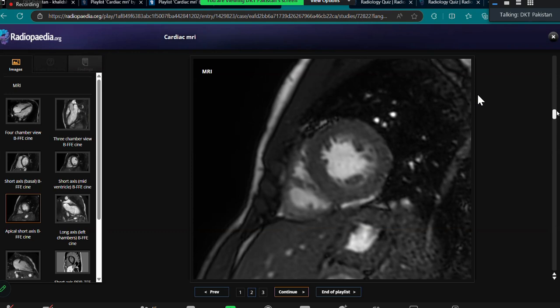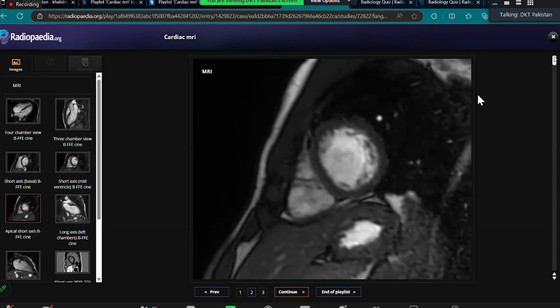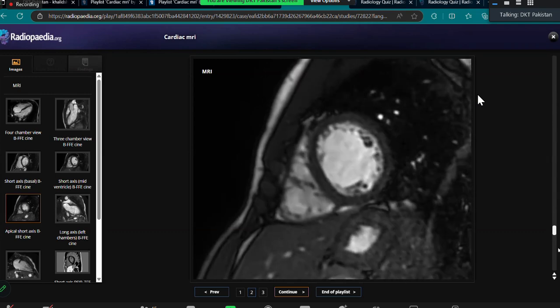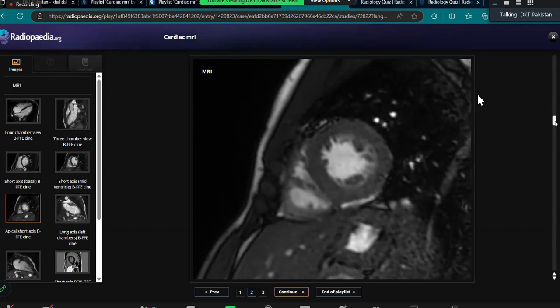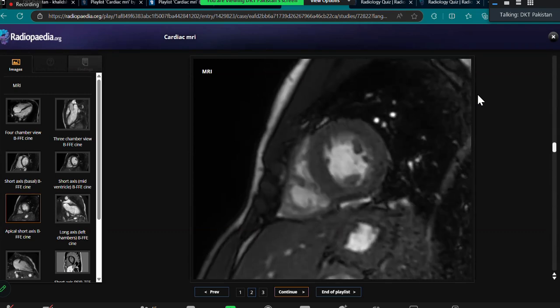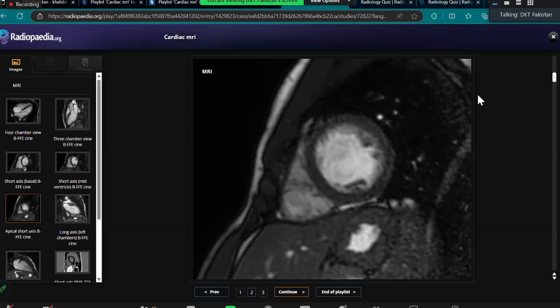So we look at the straightening of the septum only on the short axis view, even if you are doing a CT scan or an MRI scan. It is falsely labeled as straightening of the septum on the four chamber view. I always have to make a short axis view, even in CT scan. In case of PE and right ventricular strain, some people call it a straightening of the septum, although they are not looking at the short axis view, which is wrong. Good. Overall, your findings are really good.